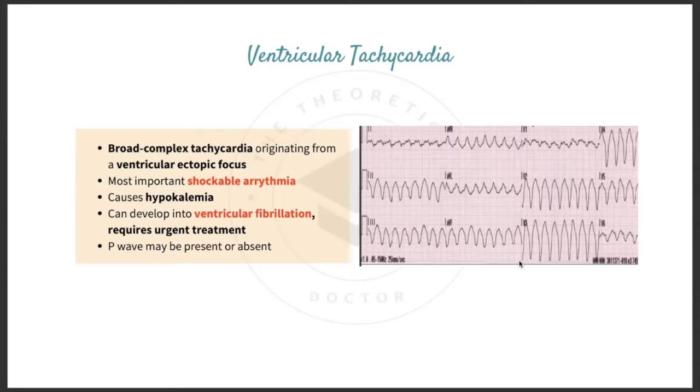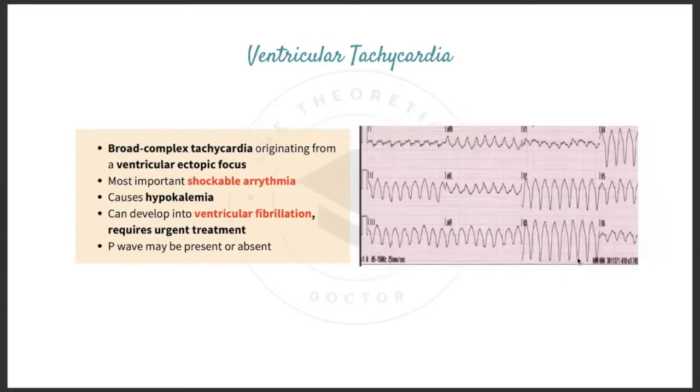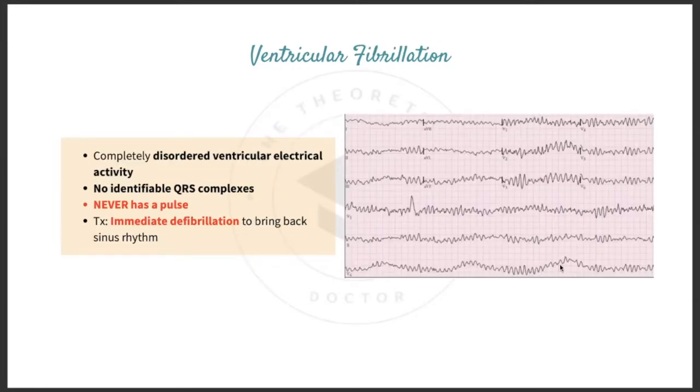So for ventricular tachycardia, you will notice long waves like this going up, going down, going up, going down. Okay? In ventricular fibrillation, everything is just gone. I call this gone case. Okay? So before I enter ventricular fibrillation, take a look at the ECG. So this is ventricular fibrillation, and this is ventricular tachycardia. So I just remember ventricular tachycardia, T, they're tall, like this, going up, down, tall waves. Fibrillation, they're like shaking.